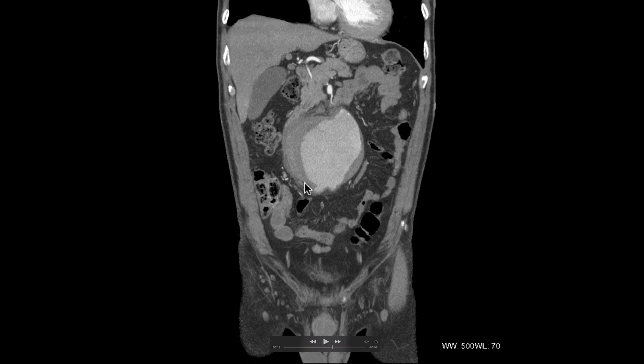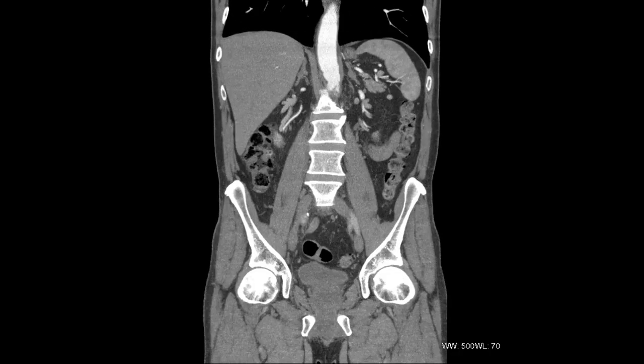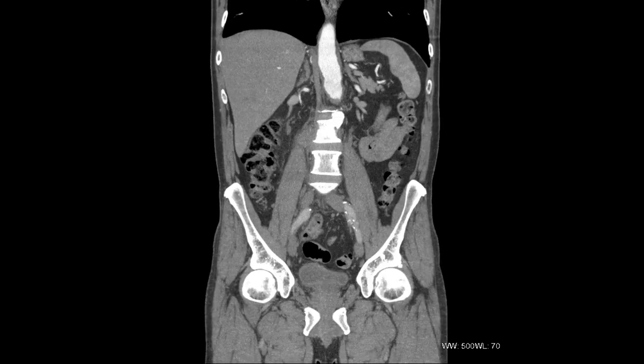So looking at a CT, we've got a system now for checking things. You've been going sort of up and down, backwards, forwards, kind of making your own video from these individual screens. Is that the way to do it? It's not just one image, but go up and down. I think when you first start looking at this, it's important just to go through one image at a time, look at it all really carefully. Yeah. But as I was saying before, so much of radiology is pattern recognition and just looking at things over and over again.